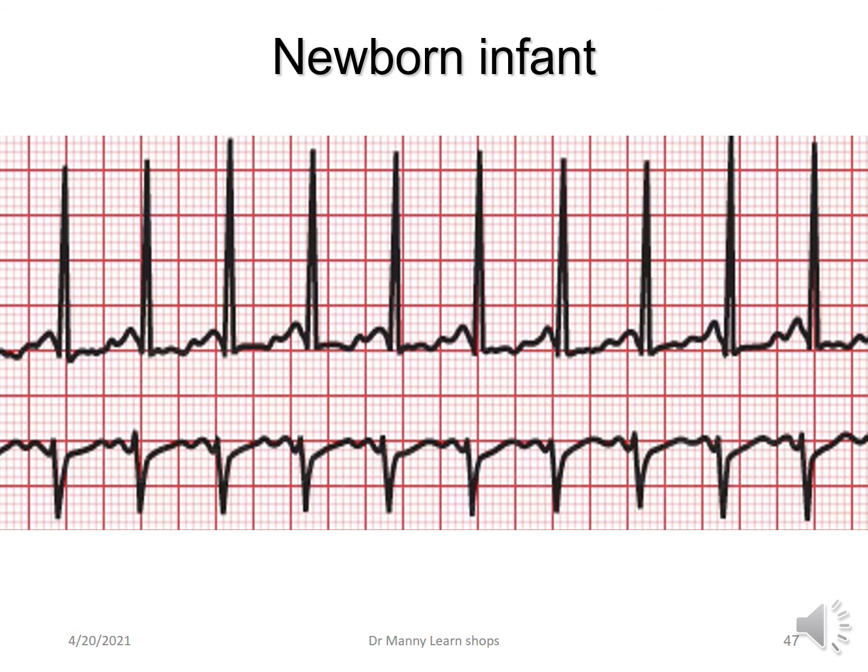Then you've got a newborn infant with no real problems, other than maybe they were sent to the intermediate nursery to be monitored, whatever the reason. This is sinus rhythm for their age group.